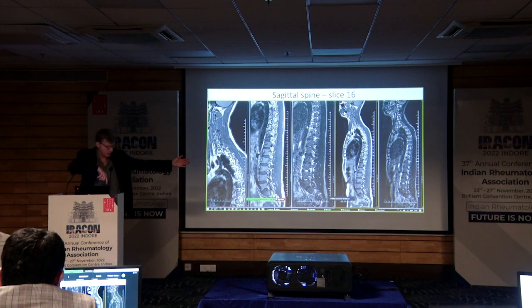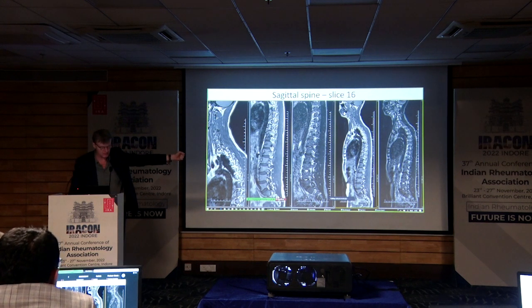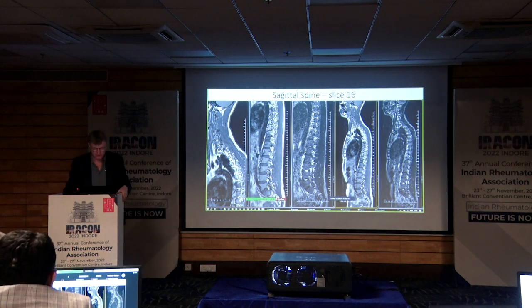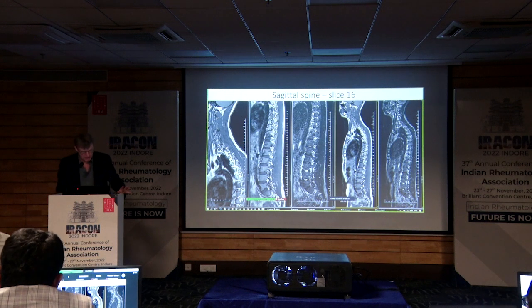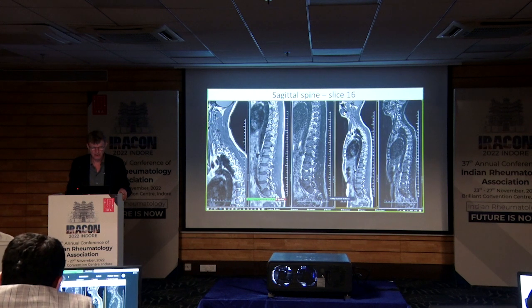Now you're so far out, we had the rib going out here. Now we're out here, crossing a slice like this through my transverse process, and the rib in front of it. There will be two round structures, far on lateral. That's what you see here. This one there is a transverse process, rib. Transverse process, rib. And so forth. And that's easy to see actually. And if you have inflammation there, then one of these circles here on the STIR sequence would just light up a bit bright.